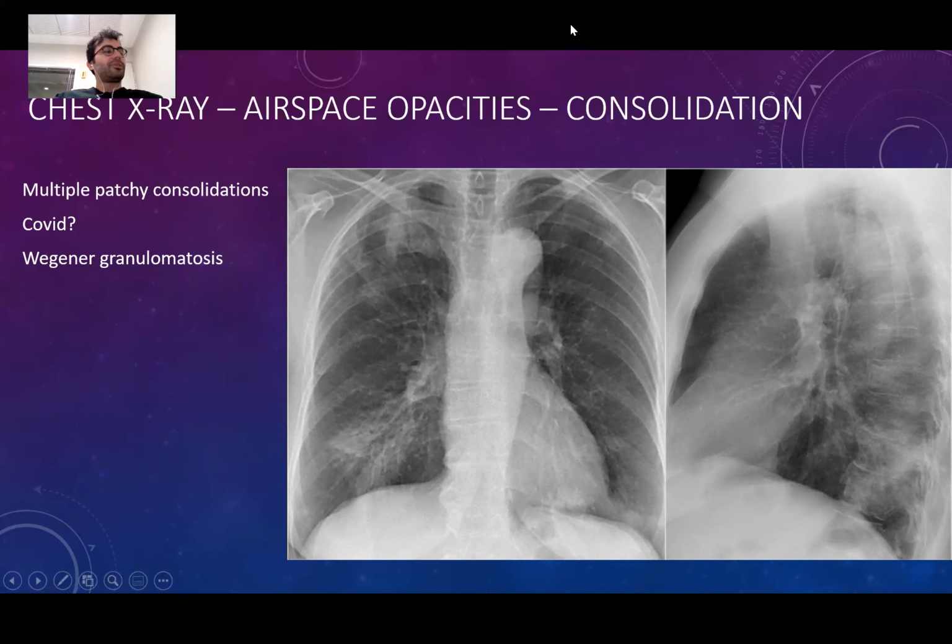COVID patient. COVID, right? Great, doctor. Thank you. Typical case for COVID. This can happen. Very good one. Thank you.